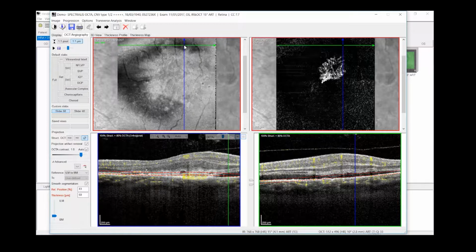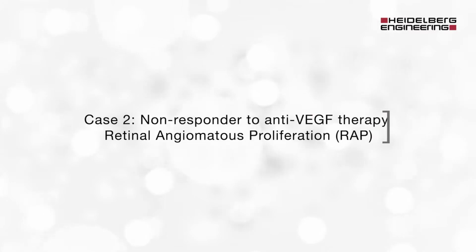Often we find that the image quality is maybe not quite so good, and a danger may arise if the clinical picture is suggestive of choroidal neovascular membrane but we can't prove it. Type 2 images are more easily seen, and in my opinion type 1 have been more difficult to identify. If the OCT angiogram does not confirm what we suspect, then we have to think of what the next step is. Either we can put together the clinical picture and the structural images and make a diagnosis, or if a diagnosis needs confirming, then conventional dye-based angiography may need to be used.